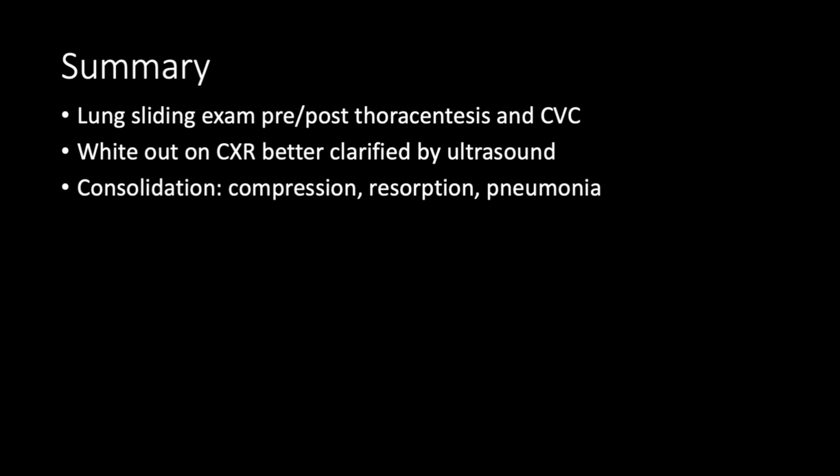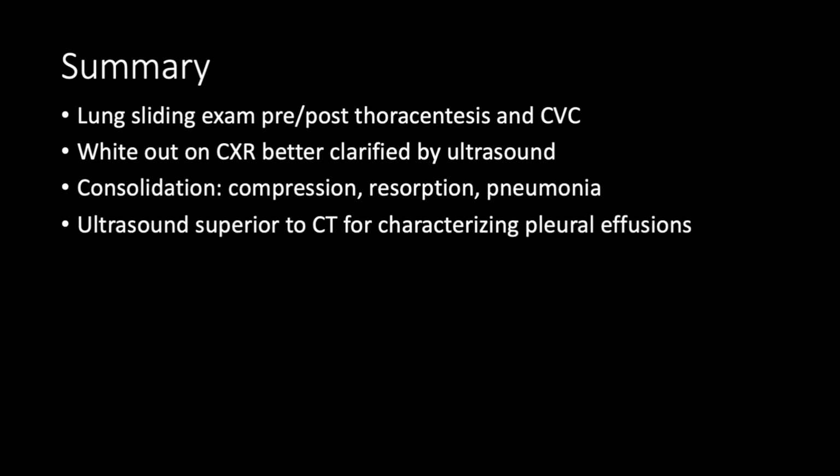Remember, there's a differential for consolidation, and it could be compression, reabsorption, or pneumonia. Ultrasound is quite superior to CT for characterizing pleural effusions and recognizing exudative ones that need further workup and management.